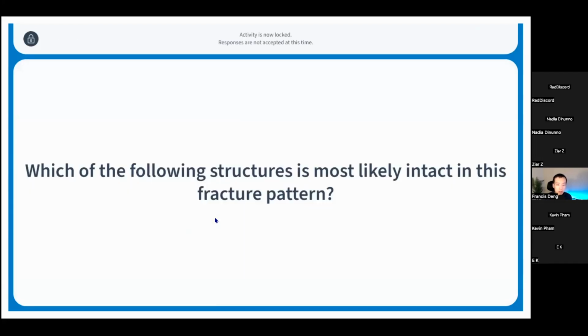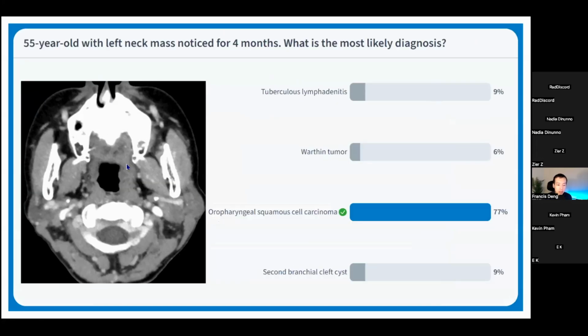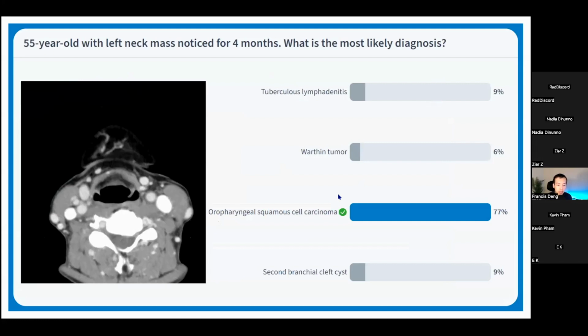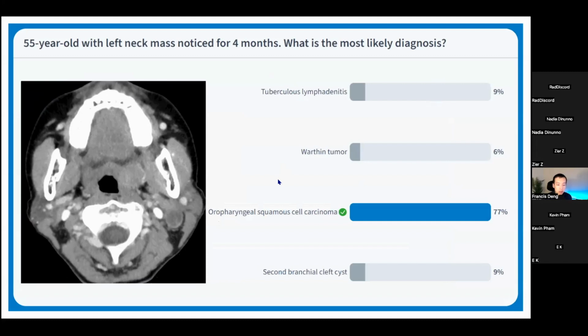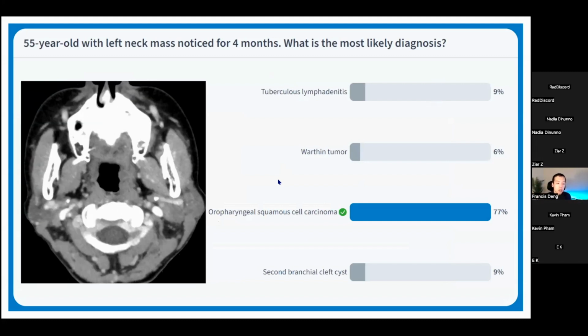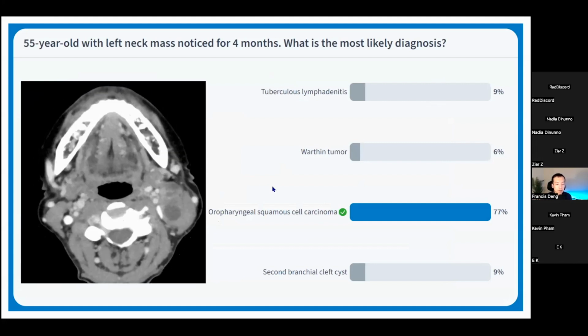And so I'm going to return to the prior question one more time just to show where the primary lesion was right here. Primary lesion located in the oropharynx right here. So if you were able to window this harder, you would see slightly contrast enhancing lesion causing that soft tissue fullness in the oropharynx.